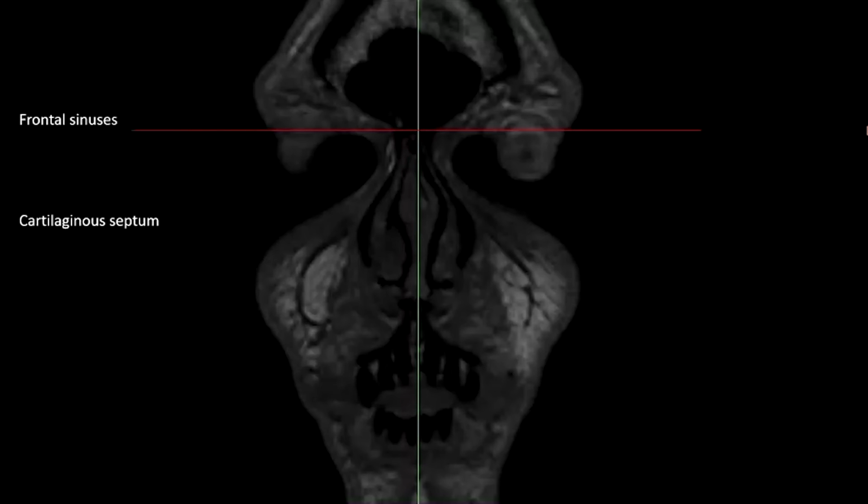this is even more tricky, MRI sinuses, because it's hard to identify landmarks in the MRI sinus. It doesn't give us the contrast that we need. But you can still normally identify the landmarks. I think it might help to turn the light off, because it's really hard to see.